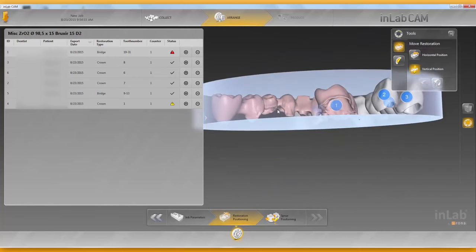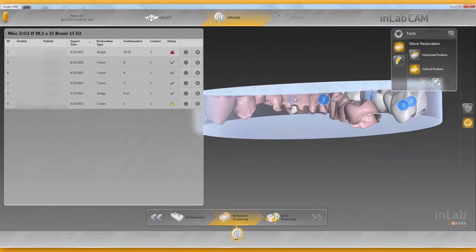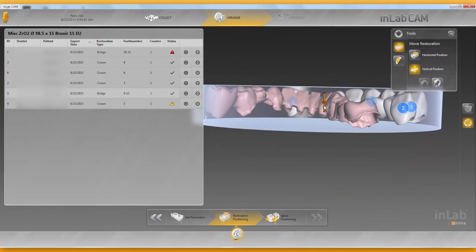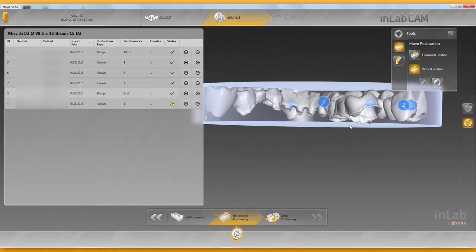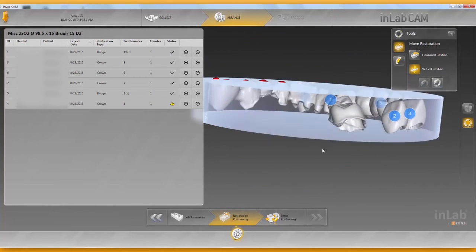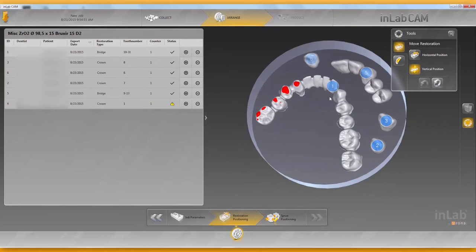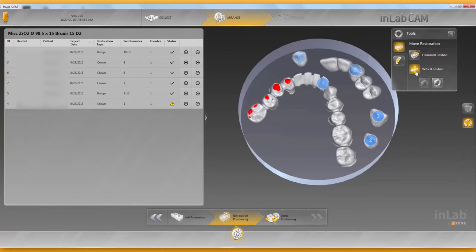It's very close. That particular margin right there and those two little spots. Let's see if we can move it up. So now we can make sure that margin mills. However, those few spots are going to be sticking out the top. So for this particular case, you might want to go up to a larger size disc. Okay, but red means that it's sticking out of the disc.